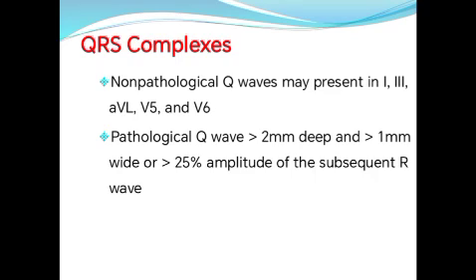Non-pathological Q waves may be present in leads 1 and 3, aVL, V5, and V6, as we mentioned before.